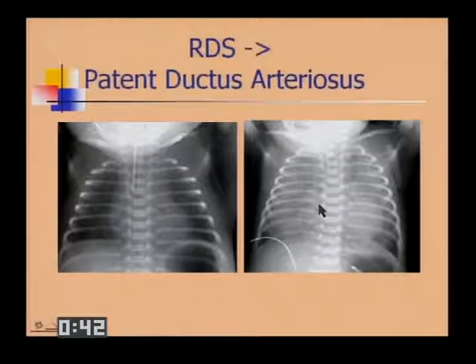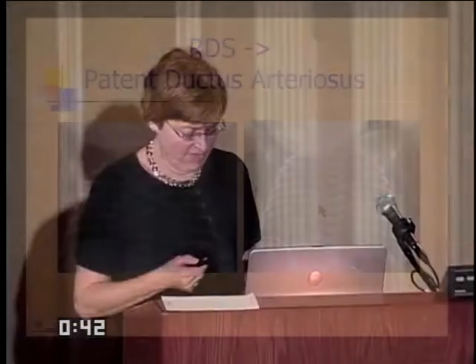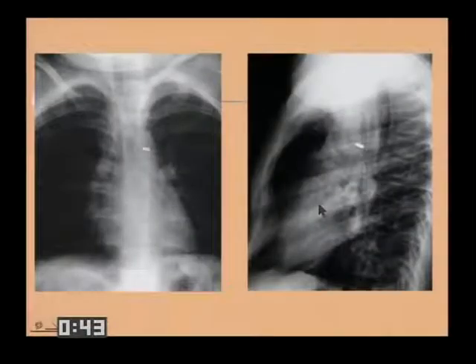blood in that sense. A lot of the preemies are stressed, and their corticosteroid levels drop precipitously, and they actually become a little bit leaky or weepy into their lungs. Many neonatal units will actually give prophylactic corticosteroids on day 4 or 7 of life in an attempt to just avert this process that they have to then correct secondarily. A little clip in the mediastinum is an indication that the patient has had a repair of a patent ductus arteriosus.